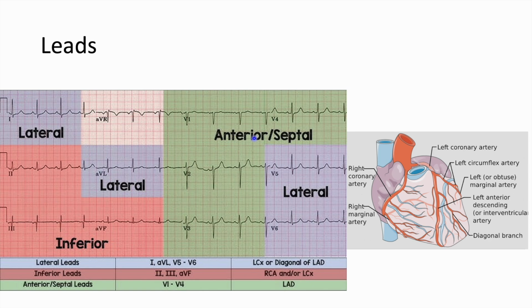And so here's your 12-lead EKG. Another thing that you want to be considering when you look at this is what location of the heart is generally being referred to when you have the different leads.